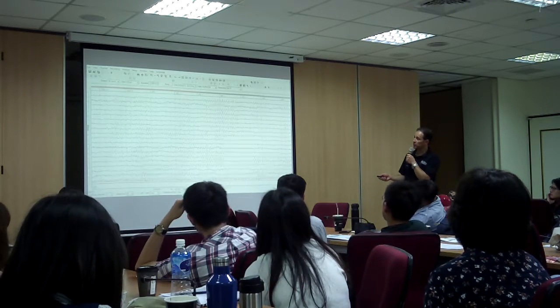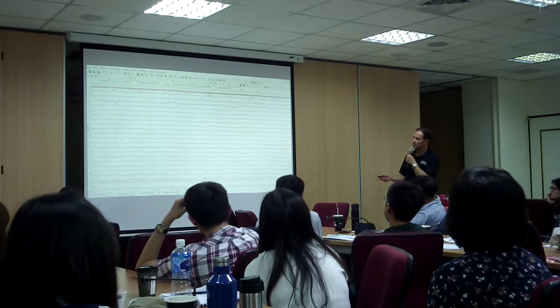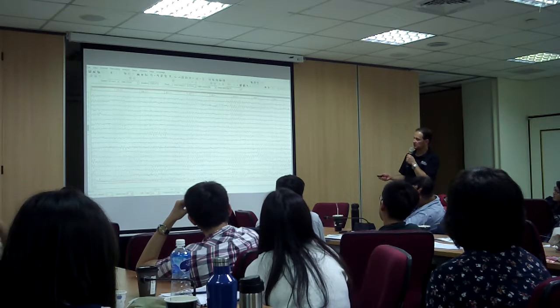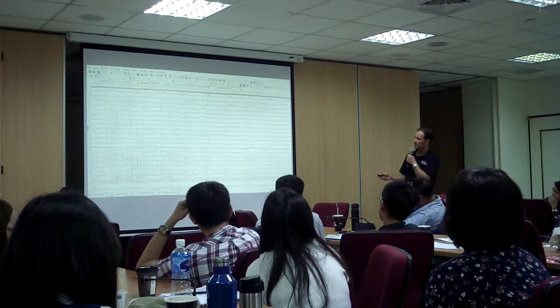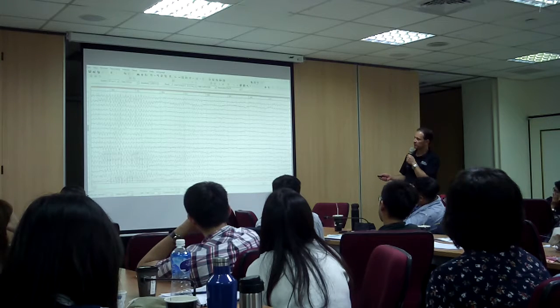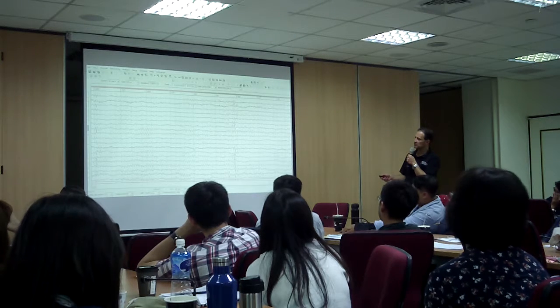And again, just train your eyes. Focus your attention on looking for that specific pattern. And here it is. See that? And there it is again.